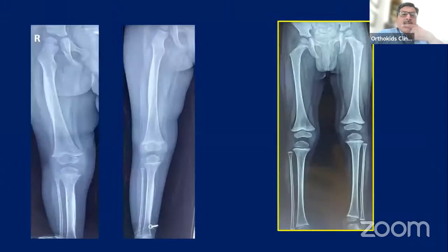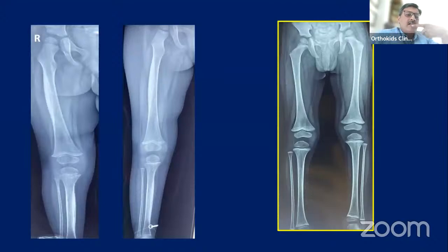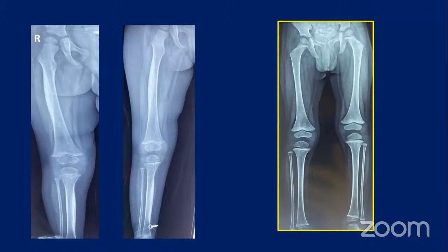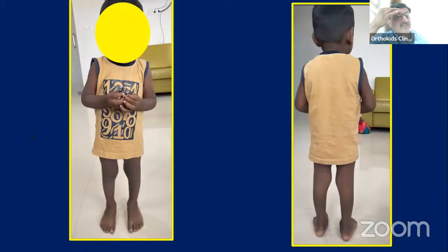Let's move ahead. And this was after vitamin C supplementation. So you can see the organized periosteum now. Excellent. So the hematoma, which was there subperiosteally, is now organized on both the femur as well as tibial side. And after 1 year, you see the X-rays, they are all normal looking X-rays. And move ahead. The child started weight bearing and he was all fine.